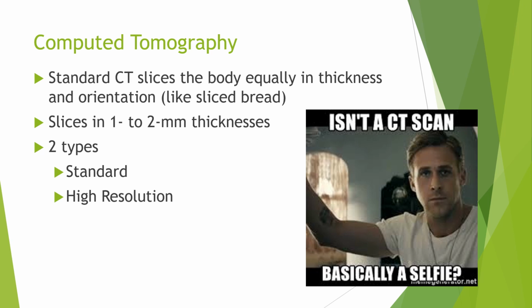All right, CT, we'll start with the easy one. CT scans is pretty much like sliced bread. It's a 3D X-ray for the most part, and usually just your standard CTs just do 1 to 2 millimeter thickness slices, just like slicing a loaf of bread, right? So they're standard and high resolution.